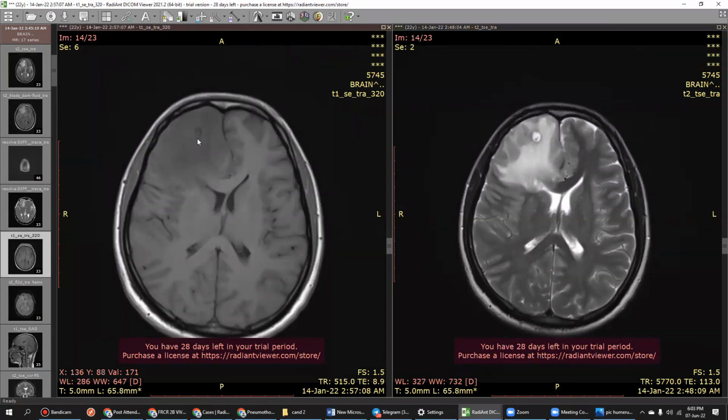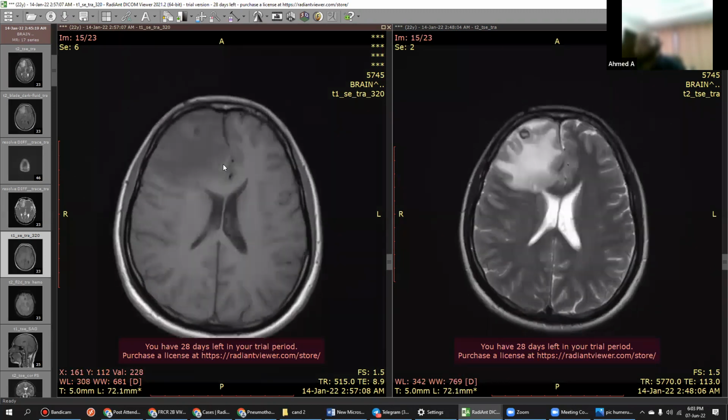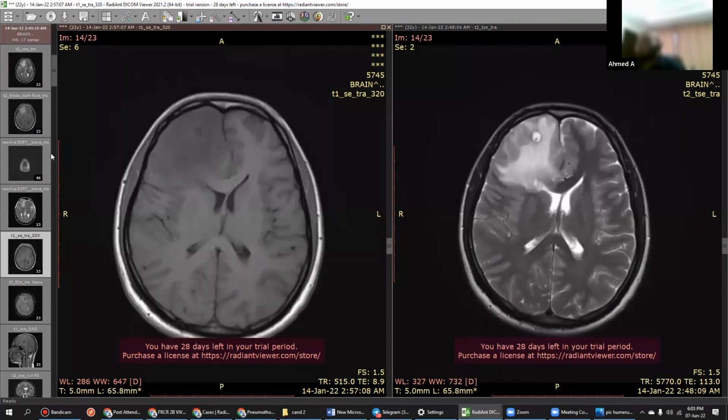Right. Okay. These cases you should not miss. What you said is not wrong, frankly. No one will fail you for it, but in these cases you would get 8 or 7.5. Understood? Once you tell it is neurocysticercosis.